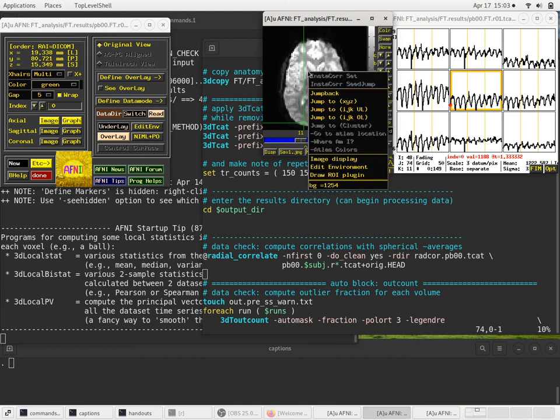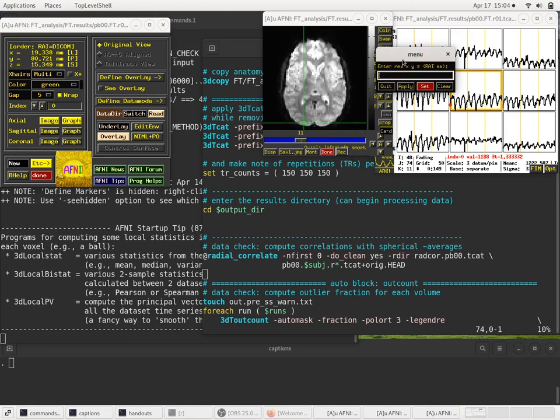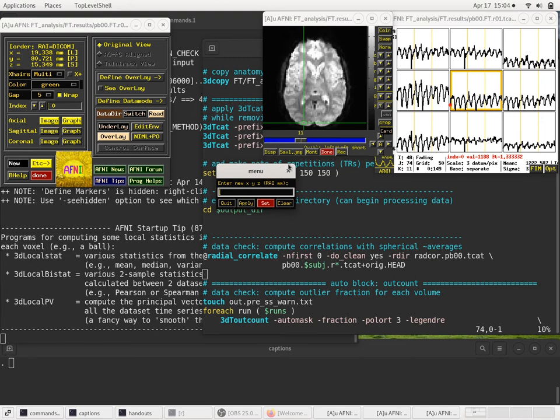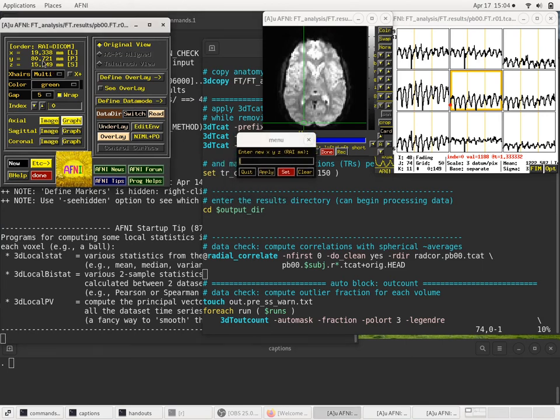So in the image window, I'll right click and jump to XYZ. And now we can specify these coordinates. And we only need to be approximate. Whatever we put in here, it will jump to the voxel center that's closest to the coordinates we type in. These are the voxel center coordinates of the one in the middle of the green box here on slice 11. Notice this 11 matches this 11. But we'll give coordinates instead of indices. So we can just type in like 19, 81, 15.